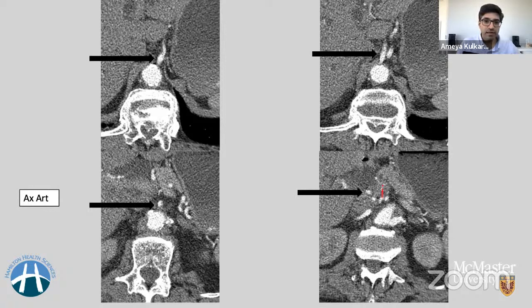So if you see these tiny vascular channels which are coming here, the one which is highlighted here is nothing but the replaced right hepatic artery, which is arising from the SMA. So there are so many vascular variants in this case. Fortunately, there was no tumor at many of the major vessels, but if there was, for example, tumor close to the left hepatic artery, you definitely wouldn't compromise the patient's blood supply to the liver because there is a replaced right hepatic artery in this case.